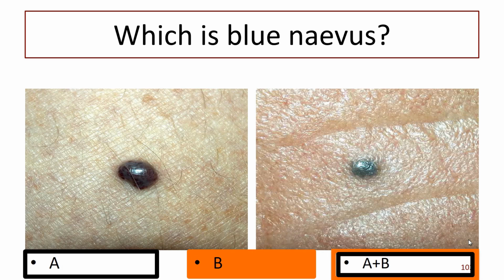Which of these is a blue nevus? Somebody is finding this one difficult. Who should we ask? That's me. Carrie, what did you think? Well, I would say the one on the right is... Yep, because? Blue. What colour is this one? It's more purple. So it does have a purple tinge, no doubt about that. But otherwise they're pretty similar. And if only I could find the right picture, I'm sure I'd be able to find one that was blue.